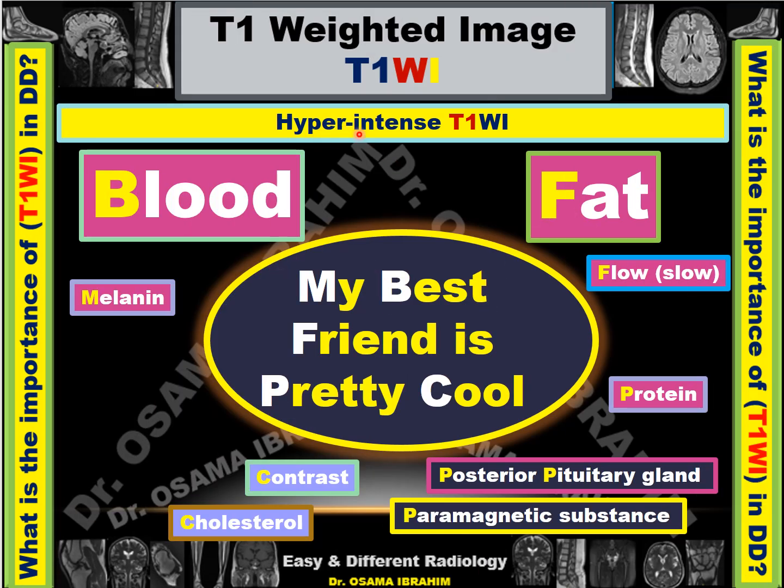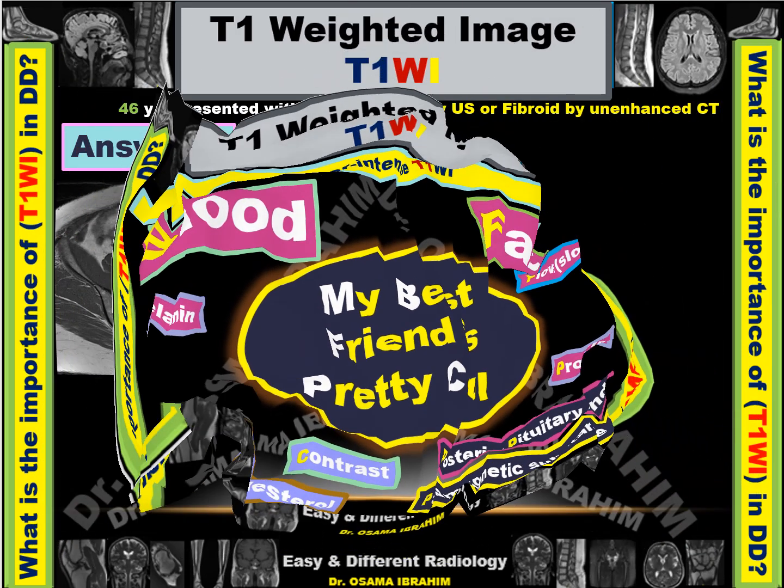So if I am presented with hyperintense T1 weighted lesions, I should go to the differential diagnosis, which is called "my best friend is pretty cool." This is a mnemonic to remember: melanin, blood, fat, flow, proteins, posterior pituitary gland, paramagnetic substance, contrast, and cholesterol. However, the most important ones in this differential diagnosis are blood and fat, which cause a high signal in the T1.